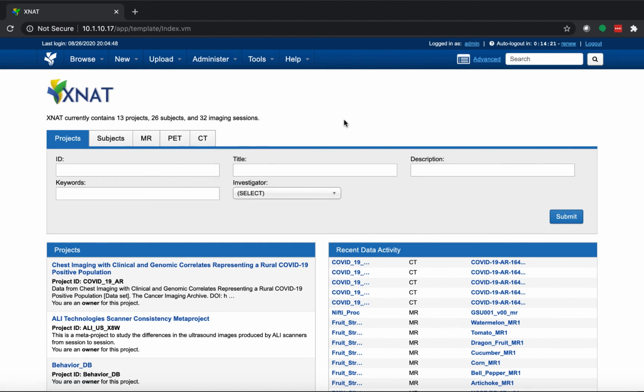Site admins are the only ones that can do things on the site-wide level like this, like installing images, enabling site-wide commands, managing your container service settings and all of that. Project owners do have some control of the elements that you enable once you've imported them, but this initial setup has to be done by a site admin.